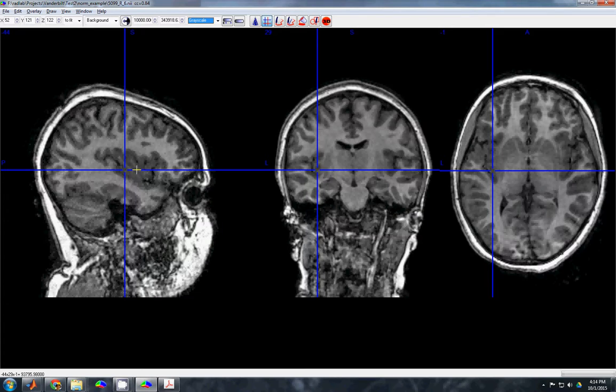We got these nice long fingers here, and then a 1, a 2, a 3. So you actually get 1, 2, 3, 4 at least easily here, and 1, 2, 3 on the bottom. So we'll get at least 7 on the bottom there too. There may be some brains, like I said, where you can only get 5. You can get 3 on top and 2 on the bottom. That's fine. You just do the best you can. Okay, and that's pretty much it for drawing out the brains.